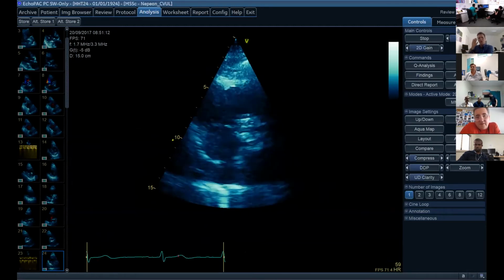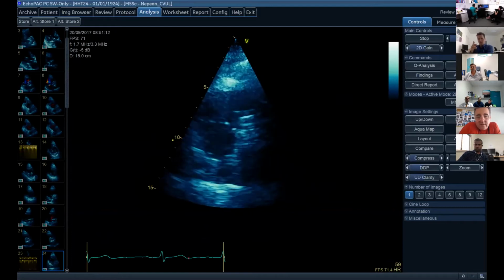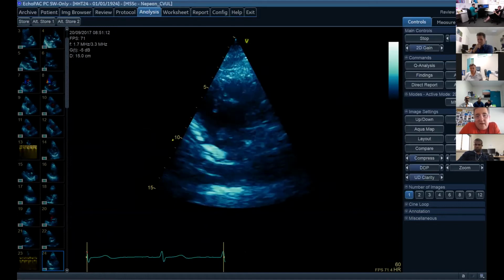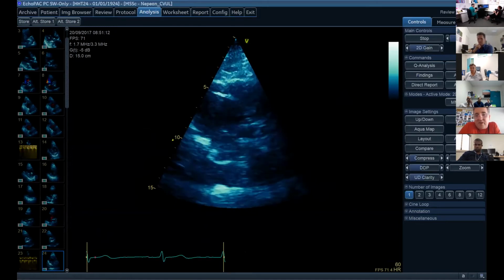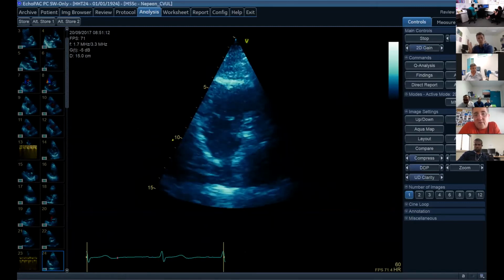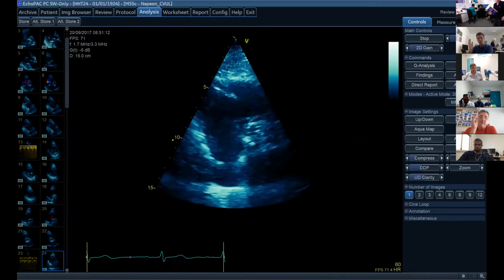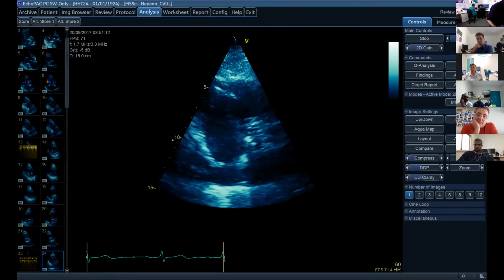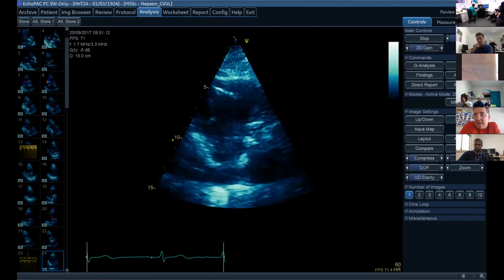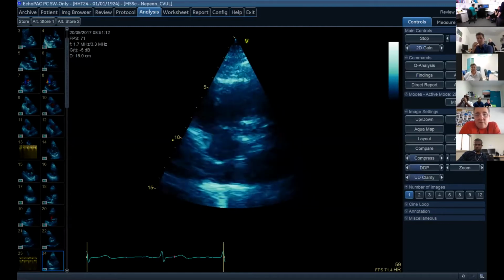I think that's a short axis view. The aortic valve is in cross section, and we're also looking at the right heart and the tricuspid valve. The aortic valve is heavily calcified, with limited and restricted motion. It would be difficult to do planimetry on that image. Fantastic. So what kind of planimetry would you indicate would be severe? Well, ultimately it's a cross-sectional area, and the severe limit would be under 1 centimeter squared.